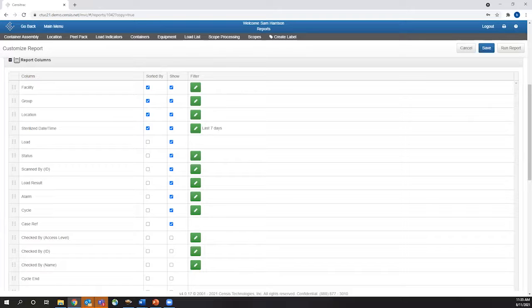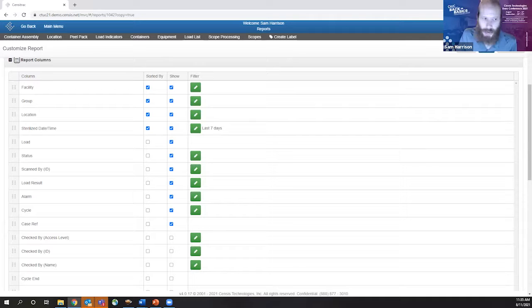And that would be where you'd then be able to say what patient a scope was used on. Yes, that's probably the better way, actually, Garrett, if you're still on the call. And it looks like you are. So if we have time, there's a lot here that we could get into. If we have time, let's definitely review the case tracking as well and kind of show you that functionality and what that looks like.